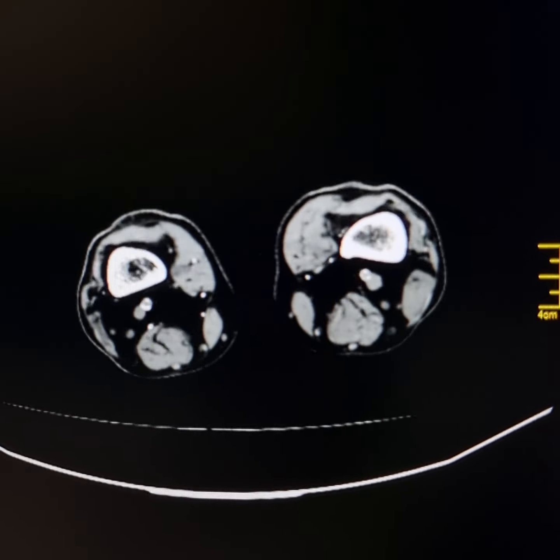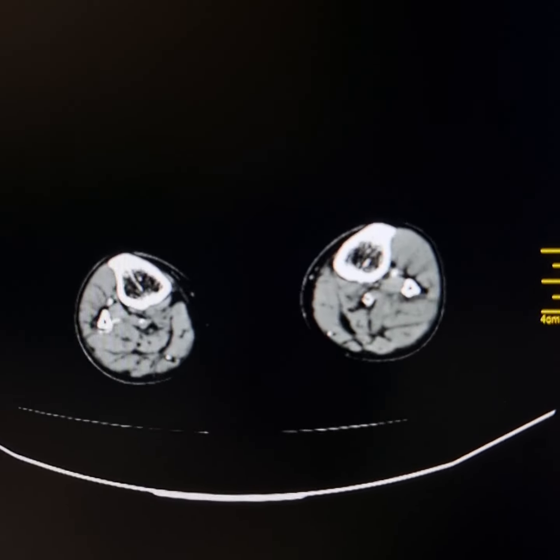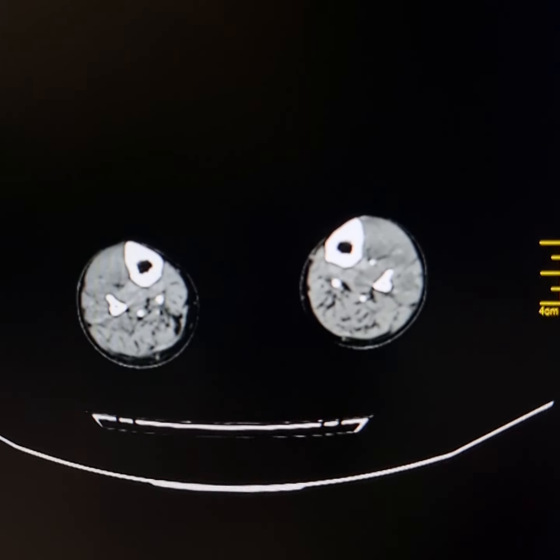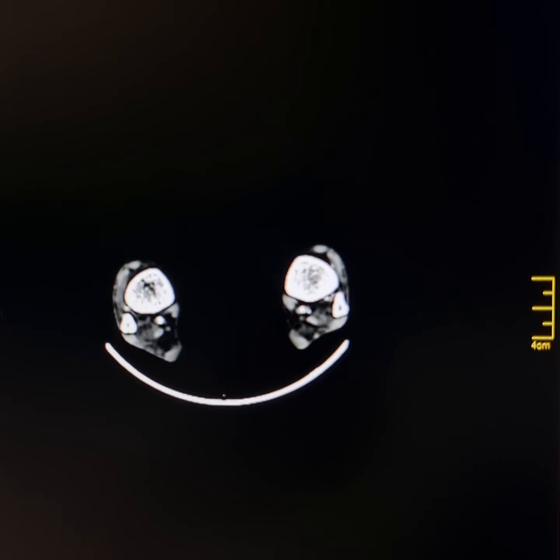In such cases, it becomes really difficult to interpret the CT angiogram because the blood vessels or arteries are heavily calcified. Now please observe these heavy calcifications making the casts of these arteries.